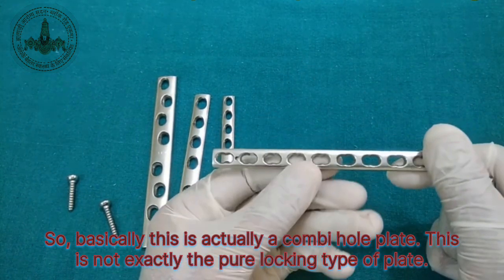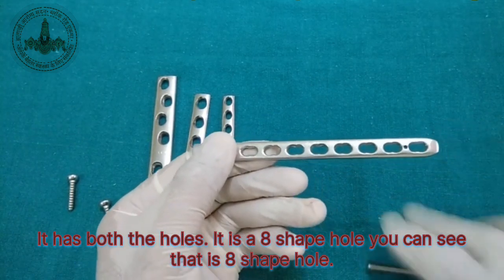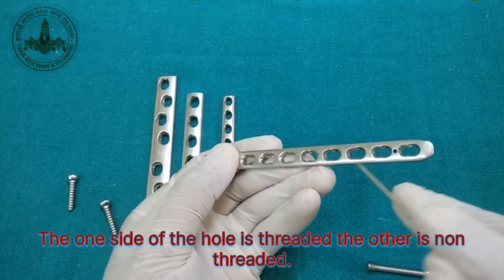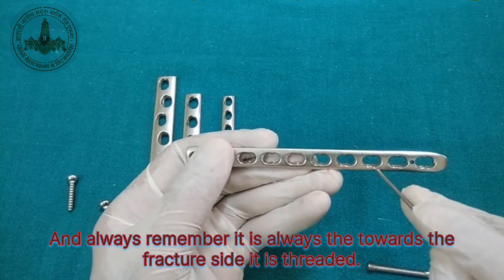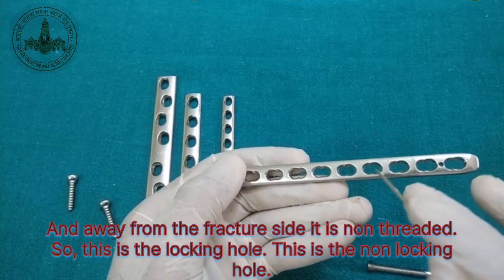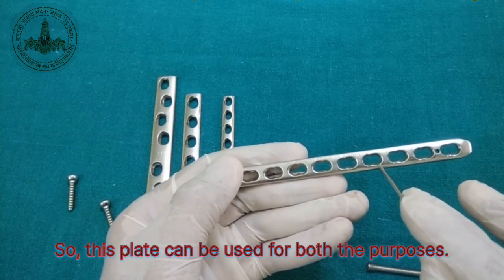So basically this is actually a combi hole plate. This is not exactly the pure locking type of plate. It has both the holes. It is an 8-shaped hole. You can see that it is an 8-shaped hole. One side of the hole is threaded, the other is non-threaded. And always remember, it is always towards the fracture side that it is threaded, and away from the fracture side it is non-threaded. So this is the locking hole, this is the non-locking hole.